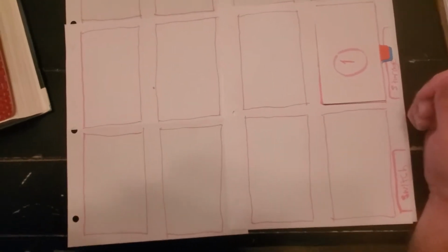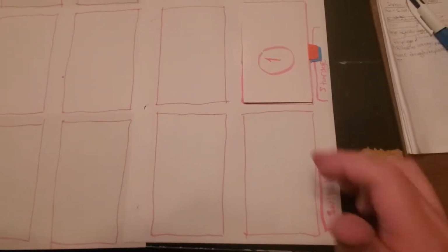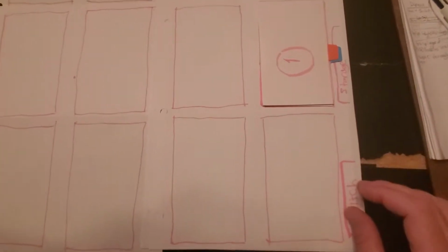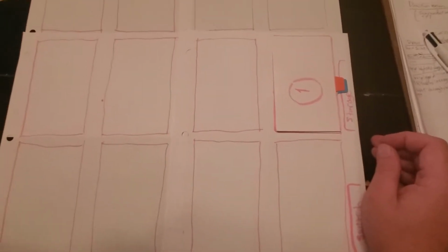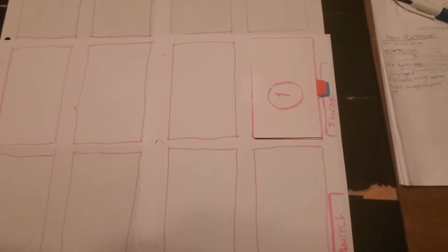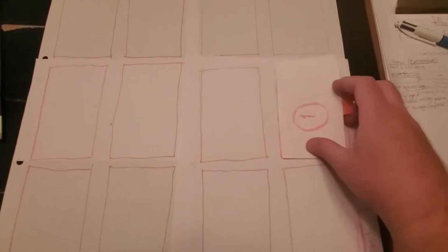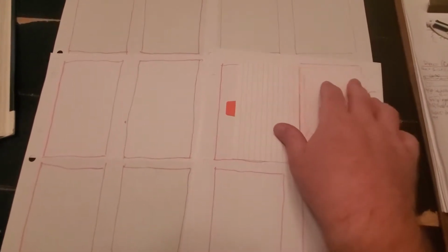In the Del, you're going to have 3 components: a pixel or pixel element, a switch, and a storage. The switch is going to tell it when to release its charge, but we're not going to really talk about that. We're interested in digital radiography. Pixel stands for picture element.